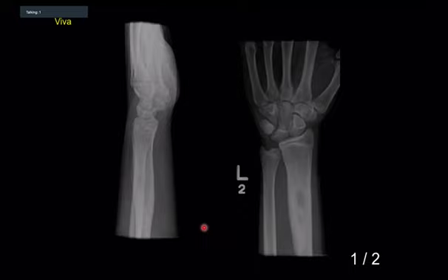There isn't a soft tissue component. The ulnar carpal bones and the remainder of the hand appear to be normal. So overall, I'm concerned about an aggressive process in this lesion, either an infective process or a malignant process. Given the location and appearance, I'd be mostly concerned about an intraosseous abscess or collection in this patient.